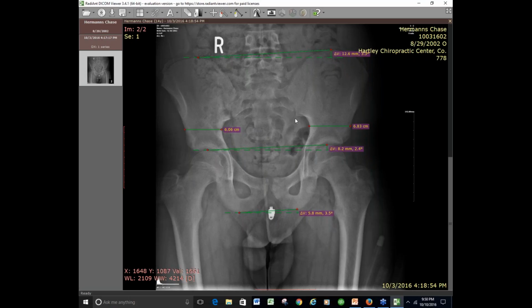68 millimeters, 60 millimeters. So this side is outflared, and as it outflares, this will get smaller. And that's why it has a larger measurement up here than it does over there. Is that right, as you outflare this, it will appear narrower on the x-ray? Yes. Whereas a flexion disorder narrows top to bottom, and an obliquity narrows left to right. Ah, yes, I forgot. Does that make sense to you? Yes. Okay, good.